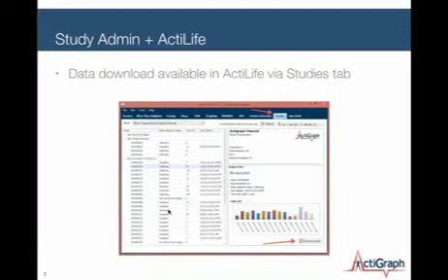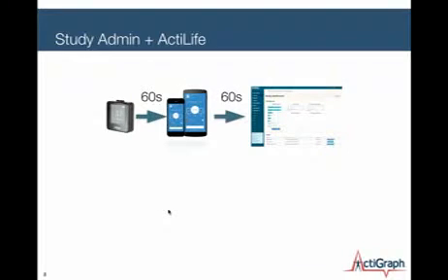We have a Studies tab built into ActiLife today, and if you click that Studies tab and log in with your login, you will immediately be brought to a page with a list of all subjects from all sites that you are coordinating. So just to illustrate, that is available today with this system. Just keep in mind that you can download this data directly into ActiLife for processing. You can download the AGD, which is 60-second Epoch data. You can do that all today right from within ActiLife. So all that's available now.